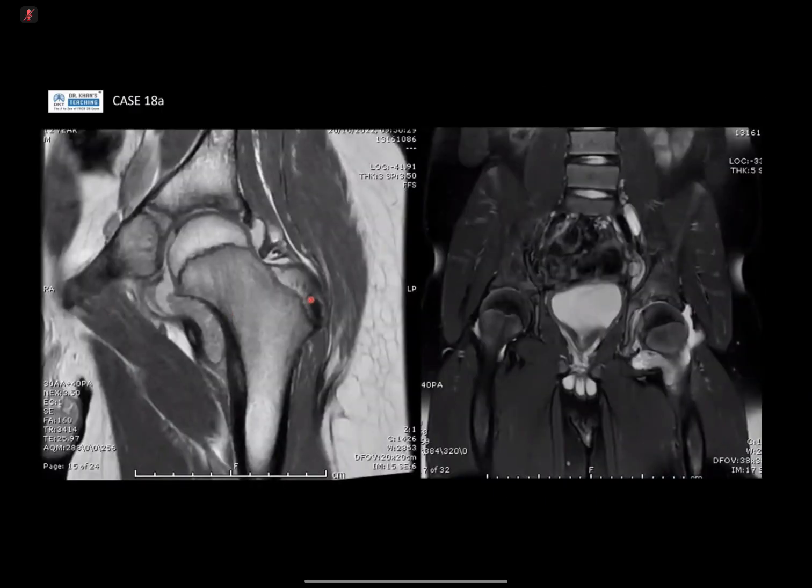So, MRI of the hip, T1 and T2 STIR, and nicely picked up. There's a large joint effusion on the left, not on the right, as there's always going to be a little bit of joint fluid that's within normal limits. What's interesting is the presence of this synovial proliferation, almost looking quite like rice bodies. It's just the appearance of it.